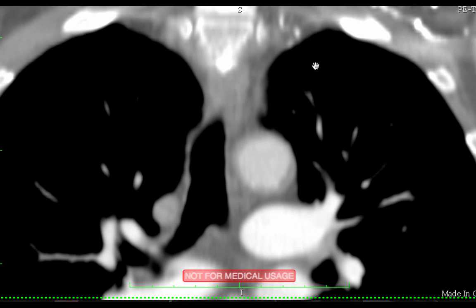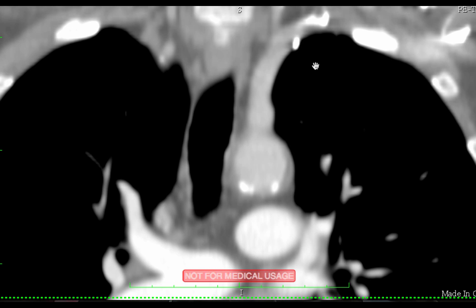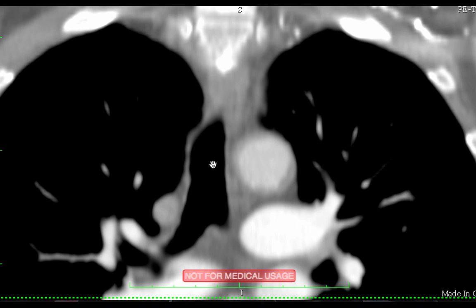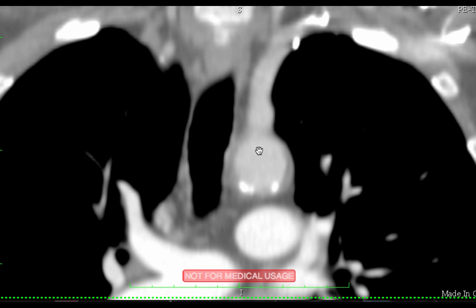Okay, so that's the aortic arch, and you can see how on a chest radiograph the trachea is displaced a little bit to the right because the aortic arch crosses right alongside the trachea on its left side. So on a chest radiograph, you usually see a little bit of a displacement, just as you see here. The trachea is displaced a little bit to the right because the aorta is on the left side of it.